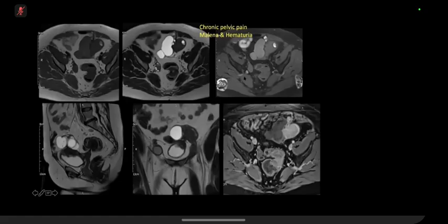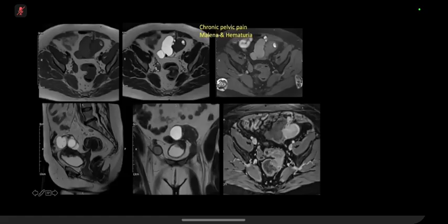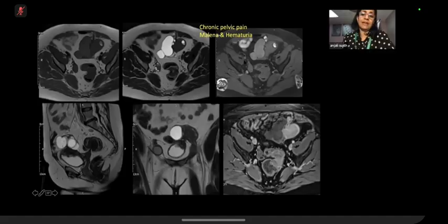So I can see there is a cystic structure anteriorly, which is low on T1, bright on T2, and then on the T1 fat sat, it's not as bright as blood, but is iso-intense to the muscle. It is showing intermediate signal on T1. And on T2, it is bright, and because the fat elsewhere is suppressed, this looks bright. So this is sort of showing a blood-like signal.